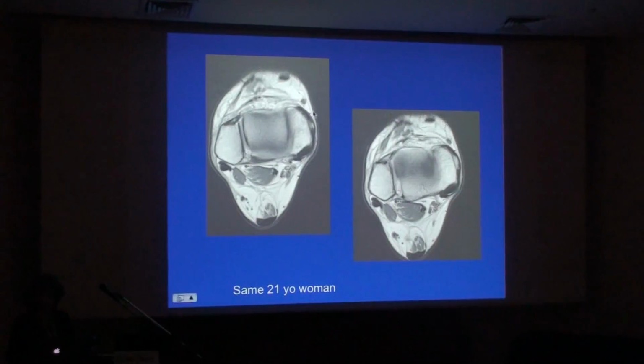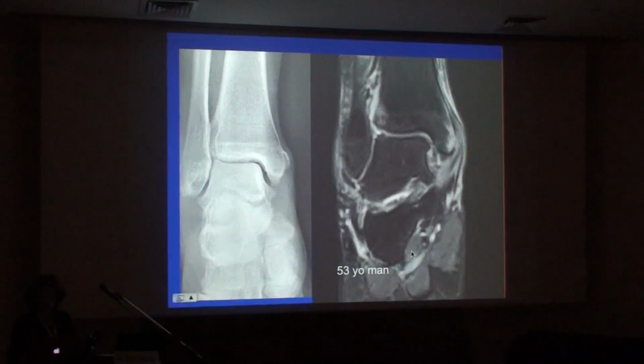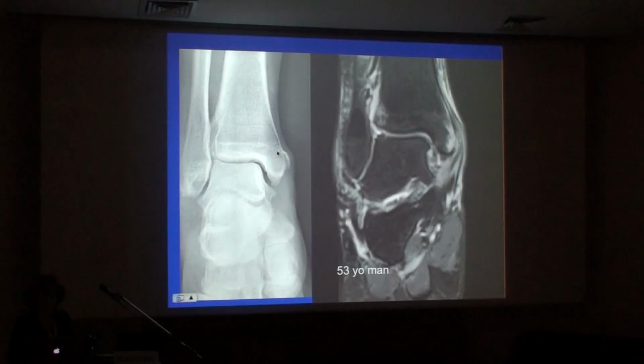And here we see it on the axial. This is the superficial deltoid coming here, and here are the ossifications. And I believe I have one more patient with similar findings. Here is the ossification, here the bump. This patient actually came complaining of a bump, and you see the stripping of the periosteum at the level of the superficial deltoid. This is the superficial deltoid, which doesn't look normal right here.